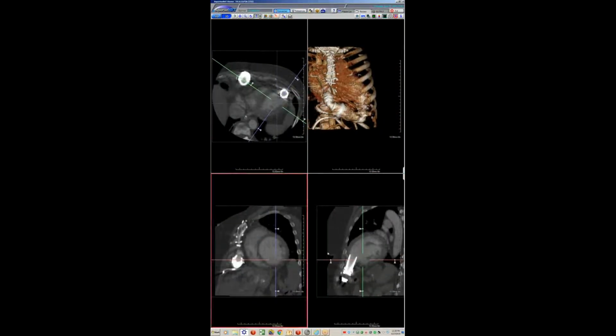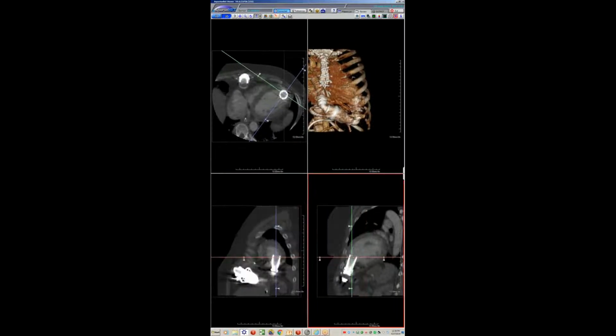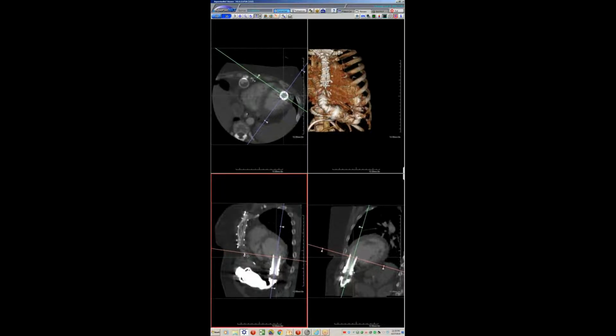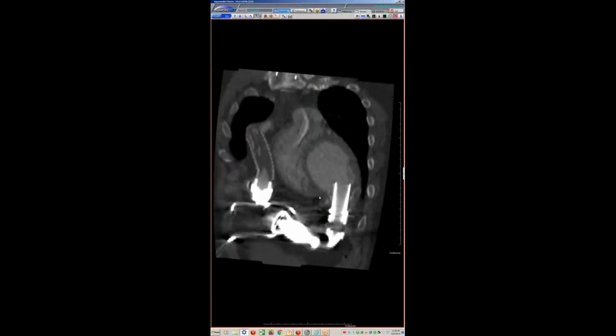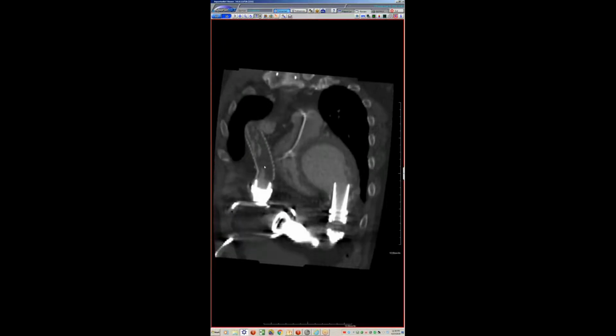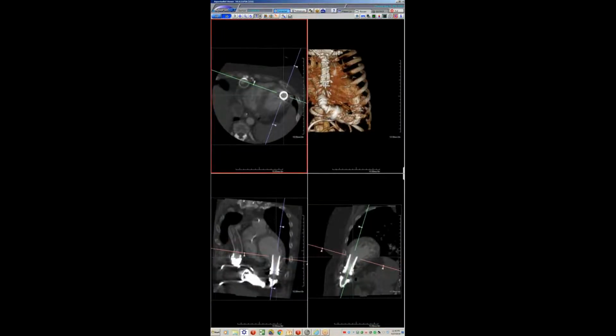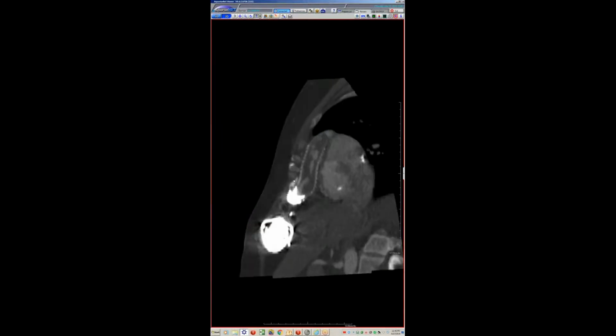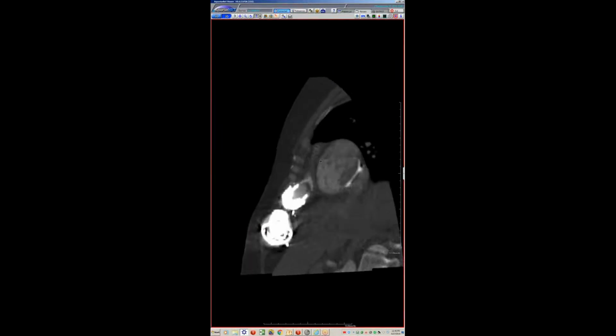So this is an old school LVAD, a HeartMate 2, which fortunately they don't use anymore. A lot of problems with these, especially with some issues with the cannula placement and thrombus. Anyways, you can see here on this HeartMate 2 that the inflow cannula looks fine. Here you can see the device and the drive line, but then in the outflow cannula, there is this very large chunk of thrombus in there, which is not good for various reasons.